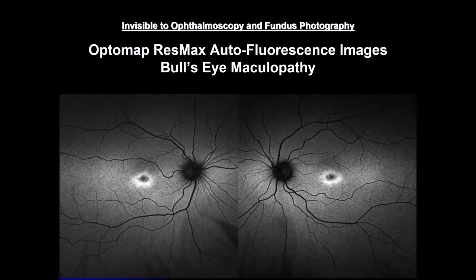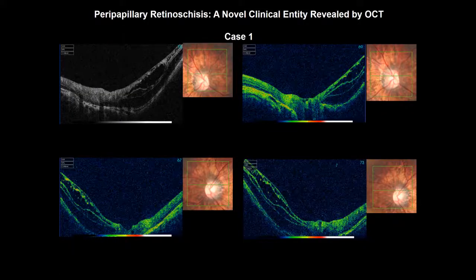And again, looking at these images, if patients are on Plaquenil, think Plaquenil toxicity. If not, think things like cone dystrophy, their color vision is going to be down. Stargardt's disease is certainly possible. So if it's Stargardt's, look for flecks. This patient doesn't have any flecks. And cone rod dystrophies also conform to that category. And this rare Accutane toxicity. This image you saw before.